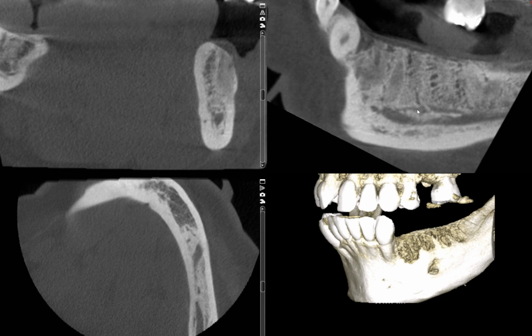I think the answer is absolutely yes, because if you're planning on a dental implant at this site, which is what our plan is at this point, normally you want to measure from the alveolar crest to the superior outline of the mandibular canal, but because of this neurovascular bundle or bifurcation of the mandibular canal, now we want to be safe and give a measurement from here to here. Let's see how much of a difference that is. So this is my gross measurement.